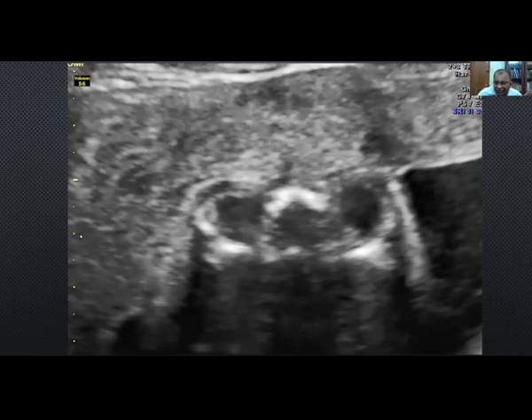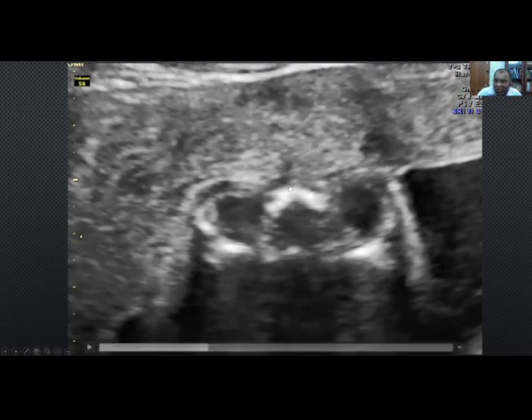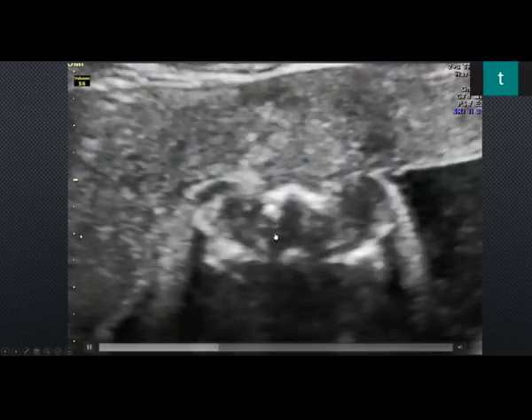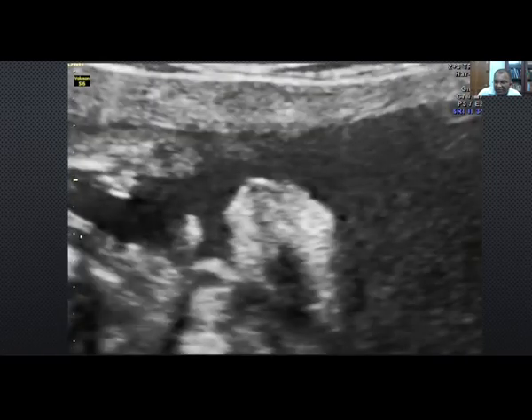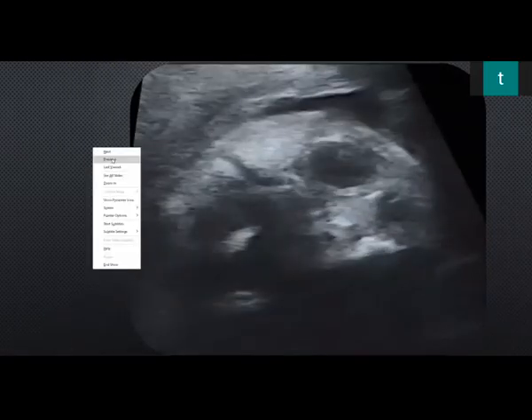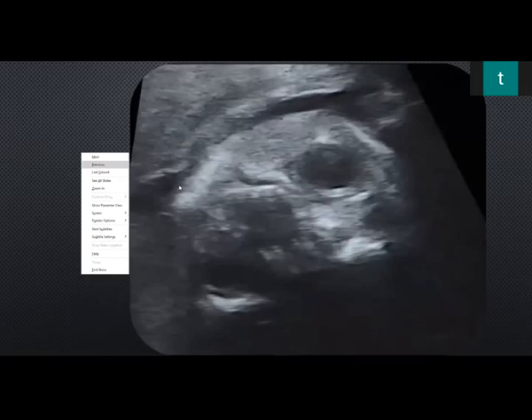All these things can change with time. You can have normal cerebral ventricles at the 20-week scan and have hydrocephalus at term. You can have normal flowing blood across an aorta, and you can have aortic atresia at term. You can have normal appearing kidneys and have real hydronephrosis at term. Bowel atresias need not present in the 20-week scan, and similarly, intraocular fluid can be normal in the 20-week scan, and you can have anophthalmos. So that is why documenting orbits is an important part of a 20-week scan in terms of images.